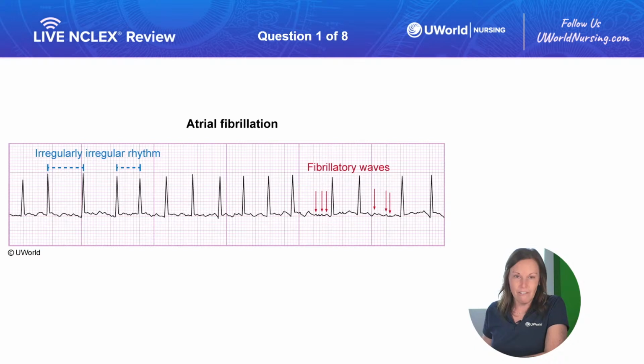What we're seeing here is AFib, so let's walk through what we see with AFib. We're going to see that irregular rhythm. The space between our QRS complexes is going to be different every time. The essential elements of normal sinus rhythm, a P wave for every QRS and the correct spacing, are going to be off. We're going to see a lot of fibrillation, or kind of glitching, of our atrium. Those are the fibrillatory P waves we see in between those big peaked QRS complexes. Essentially, there is some miscommunication, some misfiring happening in our atrium, and that gets the rest of our cardiac rhythm off.